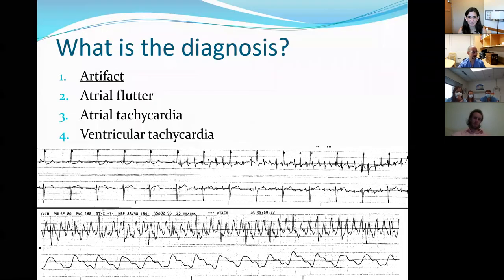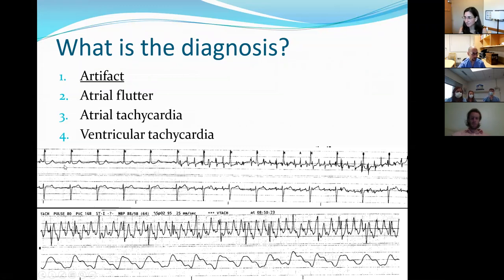All right, so these are artifacts. So we'll go back to this. The key here on the top pair, P-wave QRS complex, P-wave QRS complex as you get on the left side. And then all of a sudden you start to see this noise coming through, and those extra signals are not necessarily regular. They don't look exactly the same. And the rate is the same on the left half versus the right half. So you have not seen a difference in the heart rate. And it's really rare to have someone be in sinus and then go into an arrhythmia and not change the heart rate. And you would be using your calipers to march out your QRS complexes to see something like that.